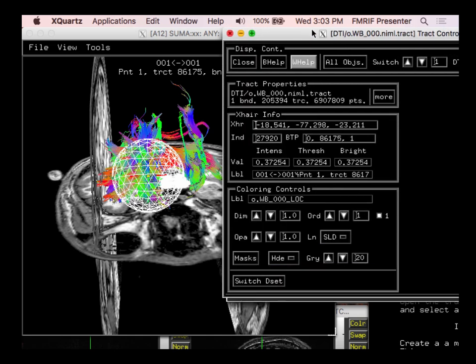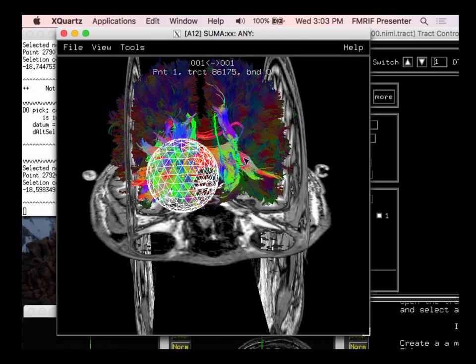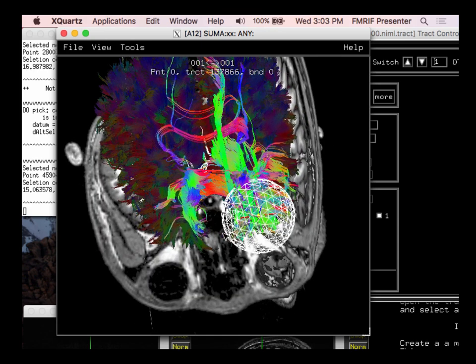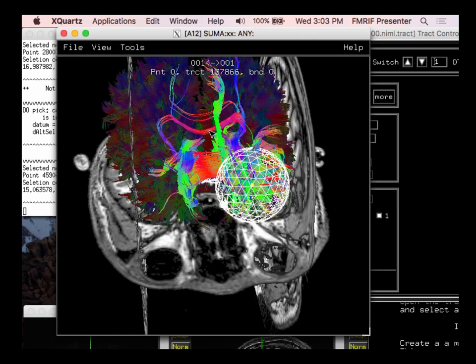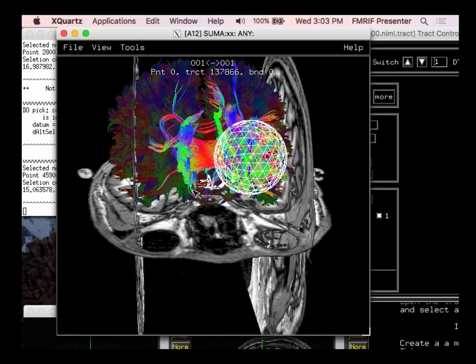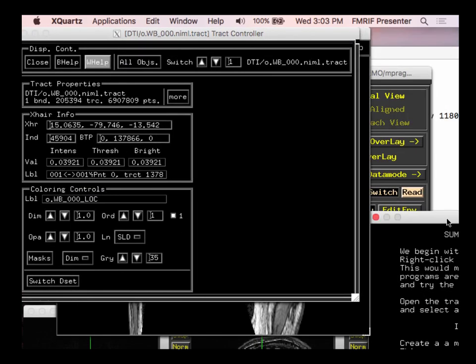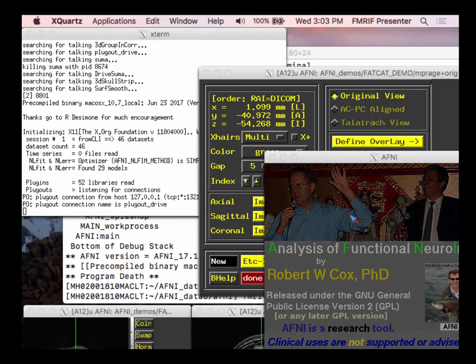And I can even look at it against a background. Maybe this is my favorite part of this. I can look at it against a background of other tracks, so I know where it is in relation to everything else, the dimmer ones. So maybe for something like surgical planning or just investigating your data in various ways, this may be useful. But again, this really depends on having a three-dimensional representation, so I can put these lines and things in that are embedded.